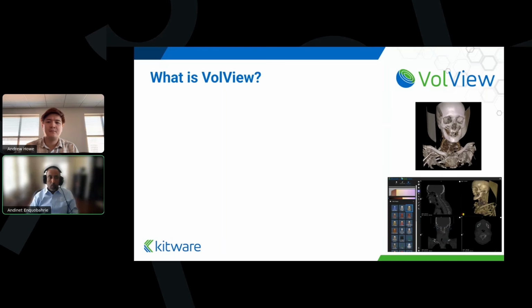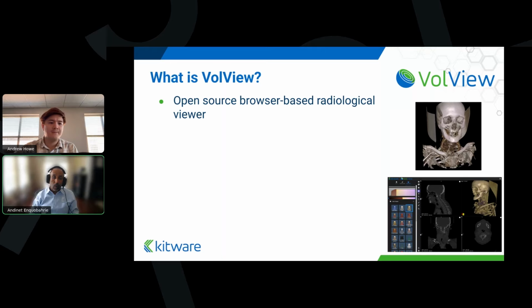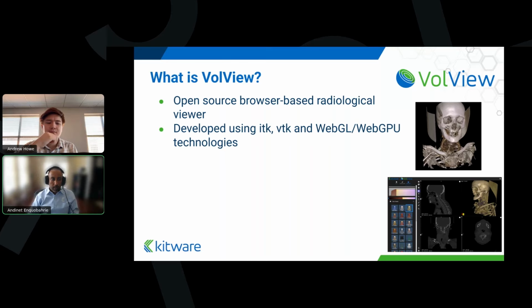All right. So what's VolView? VolView is a web native imaging viewer. And you know, there are other types of viewers out there. What's very exciting about VolView is you can do all the rendering right in your browser. So you don't need a very beefy, heavy workstation, you can just do rendering within your browser. It's a client-side rendering library.